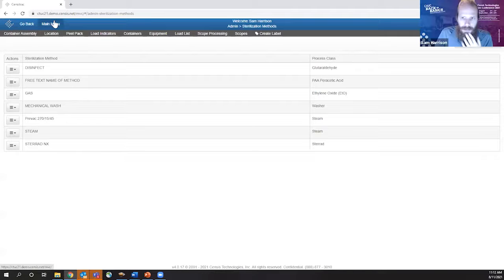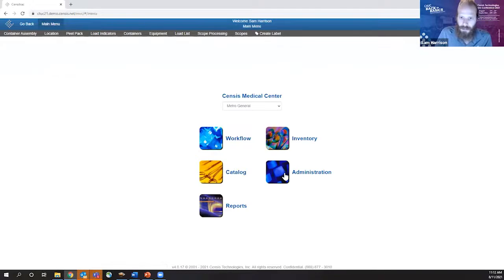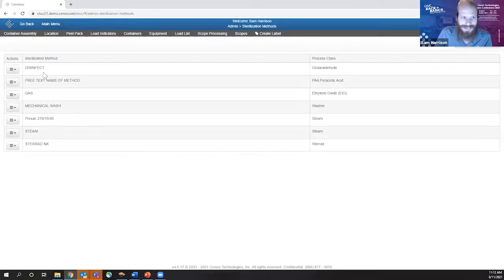All right, let's check. Let's go back, and I just want to double check. Okay, so what we did there, I'm going to pause here. I'm going to go to sterilization methods, and we put in our sterilization method name, and we gave it a process class of what that actually is. So your process class is like the chemical, right? But your name, you can say whatever you want. Okay, it's free text.